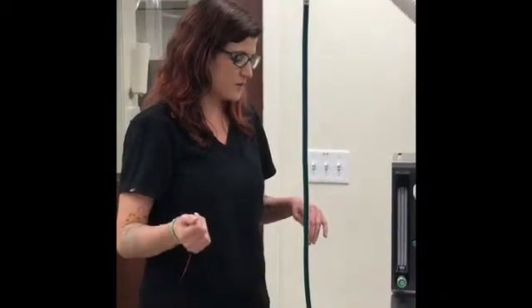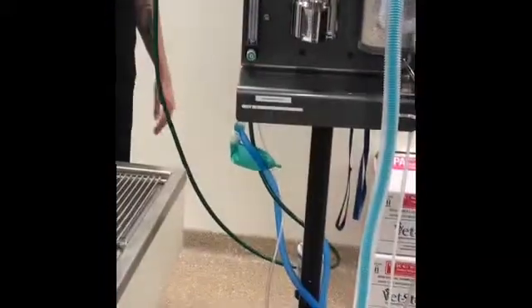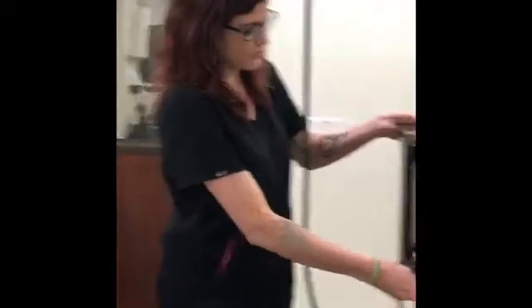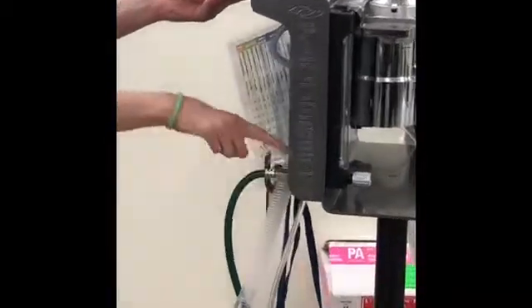The H tanks are the giant ones that are outside of the building and connected through a series of hoses throughout the hospital ceilings. And some machines are connected to E-tanks, which are the portable tanks. Those can be used for various purposes. A lot of times they're actually hooked up to the machines. So first we have where our oxygen is actually hooked in through this hose, through this valve right here.